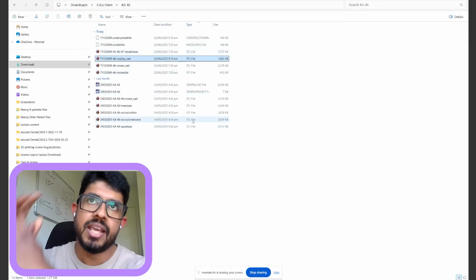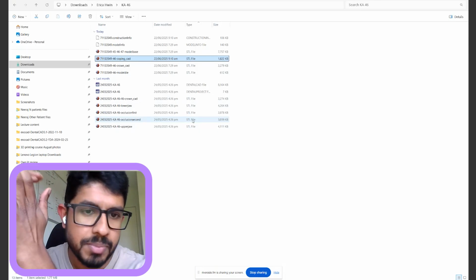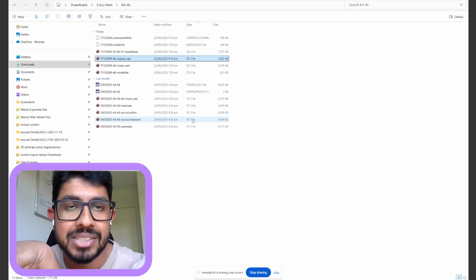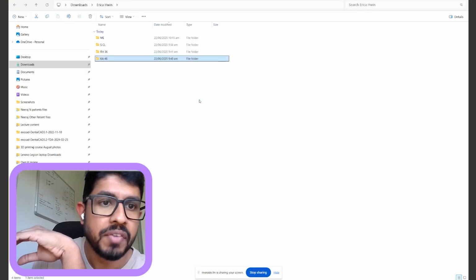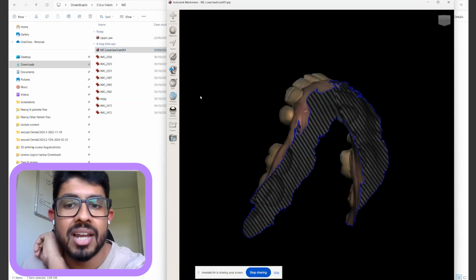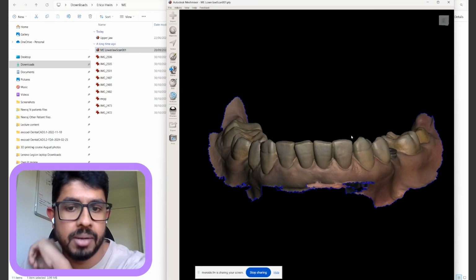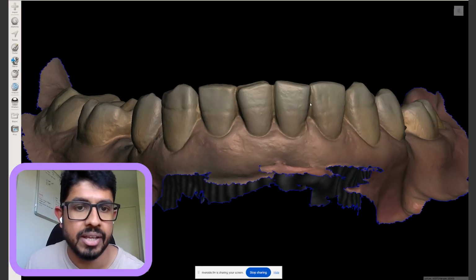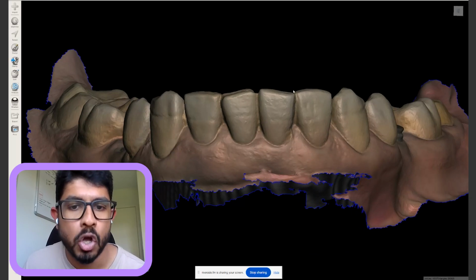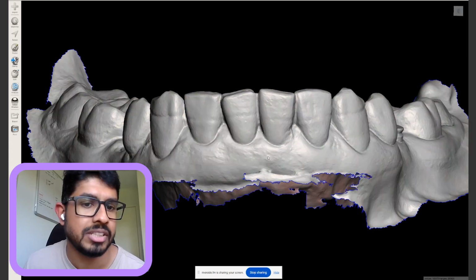Okay. STL files, that stands for standard tessellation language. I'm just being fancy with the terminology. It doesn't really mean anything. But STL is basically something that's monochromatic. But if I go into a PLY file, that's actually something that has color in it. Within exocad, this is just on mesh mixer, but within exocad, you'll have a toggle option like I have over here to just switch between color and otherwise if I need to.